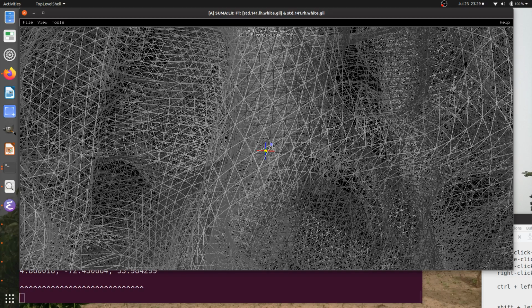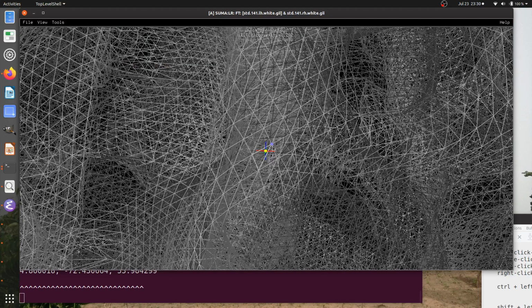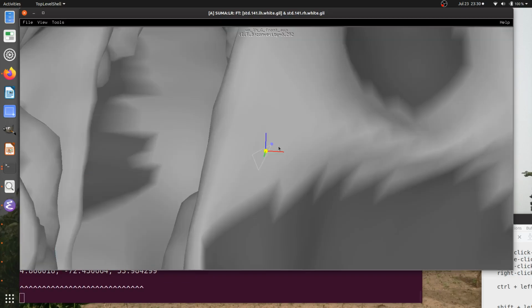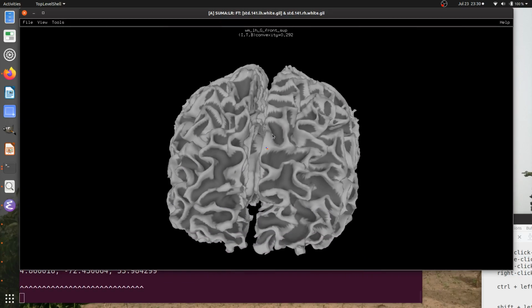And then sometimes we can also think about, let's say if I could draw a radius out on the surface, and then find all the nodes within that radius, something like that. So those are the ways I would define a neighborhood, by direct edge connections or through all the nodes within a radius constrained to the surface. Okay, so those are the pieces of information there.